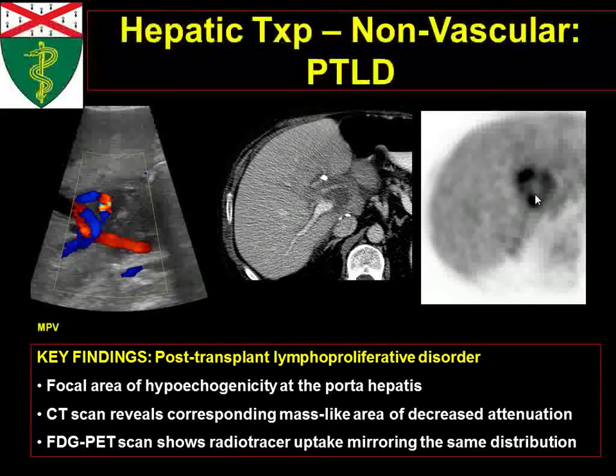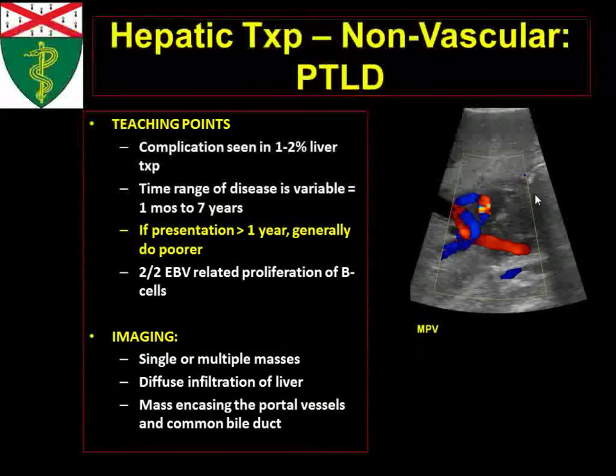And so ultimately, you're not going to know this is PTLD. I mean, if you have a PET CT, that's going to be much more obvious. That's probably what it's going to be. But it's got to be somewhere in the back of your mind. You can't forget about that. Okay? Now, it can happen.